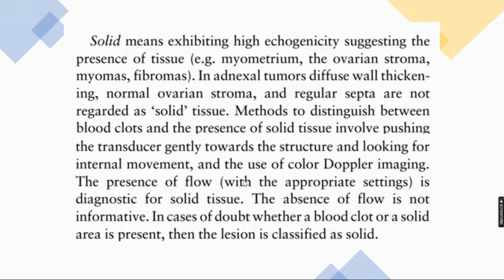Importantly, the Doppler settings must be appropriate. If there's any doubt as to whether the lesion is blood clot or solid lesion, it should be classified as solids.